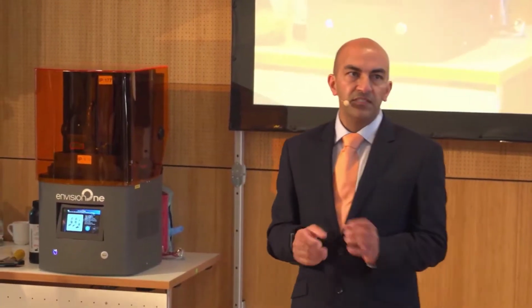What Udo said there is really, really important at the end. This is a medical device. Clients of ours say, should we keep these? Should we take out the sleeves? Should we reuse the sleeves? The answer to all of those is no. If you've gone to the trouble of designing these guides and planning these, it's a medical device that's actually owned by the patient. It's part of their record, at least it is in the UK. The rules in Europe are becoming stricter.